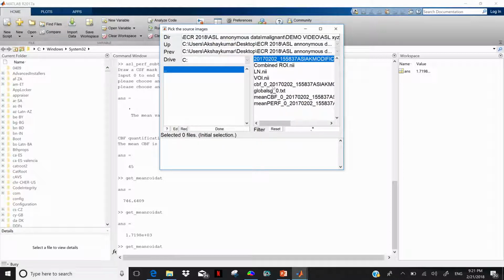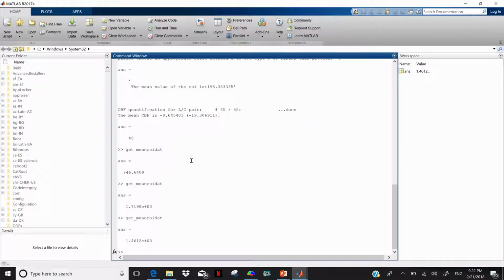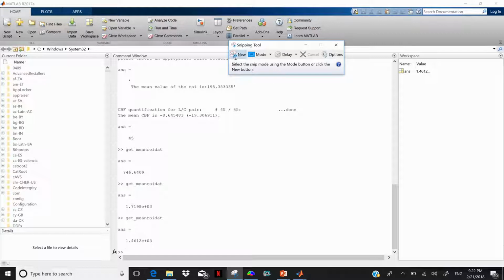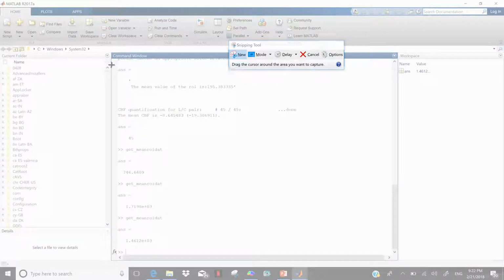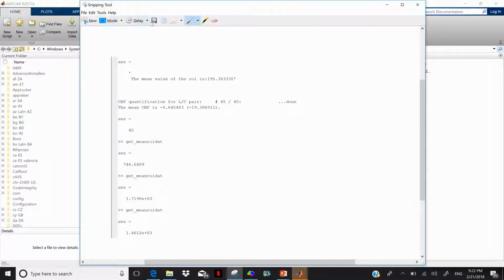But using this open software, oh my god, yes, this actually calculated the average of this. Awesome. Using all this open software, we could get a good idea and talk with each other.